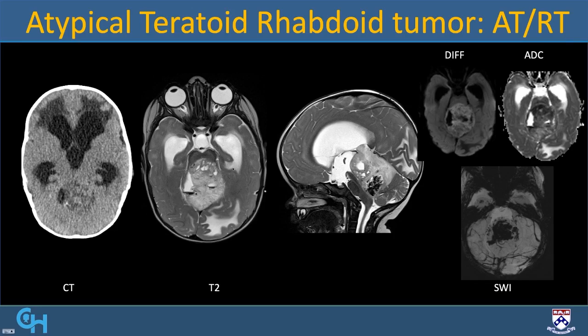On MR imaging here in this example of ATRT, you are seeing this very large heterogeneous mass with solid components, cystic components. There are blood products, hemorrhage within, which is much more well demonstrated on this sagittal image, the areas of T2 dark signal, which is the hemorrhage and cysts and solid components.